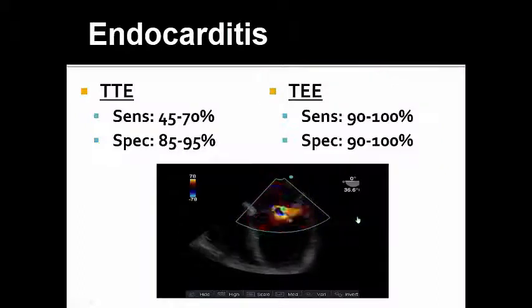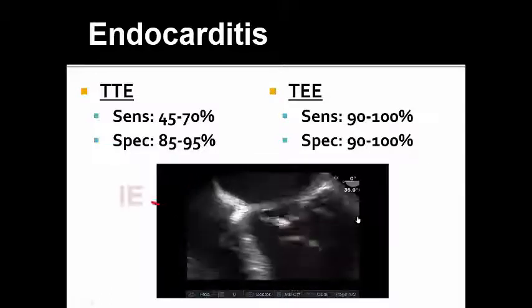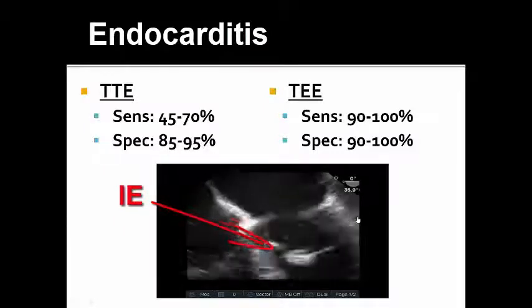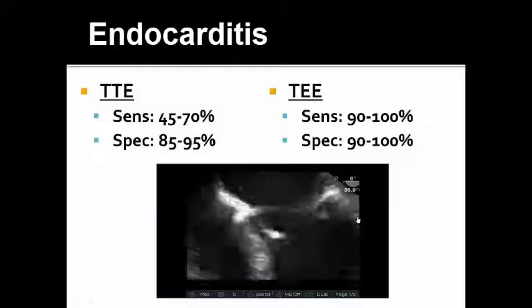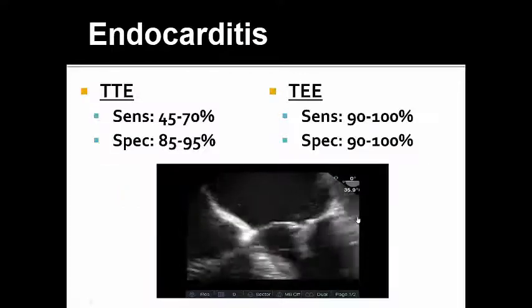Since the specificity of TEE for endocarditis is quite high, helping to rule in endocarditis, even in the point of care setting, can be very helpful. Ruling out infective endocarditis, however, requires a specialized skill set, which takes extra training, and many TEE studies performed and read to be proficient at.